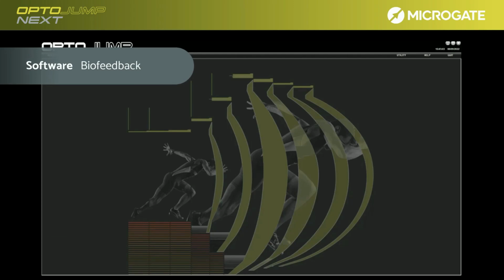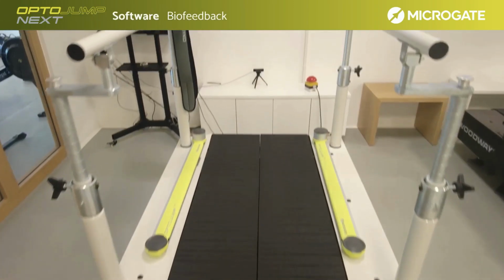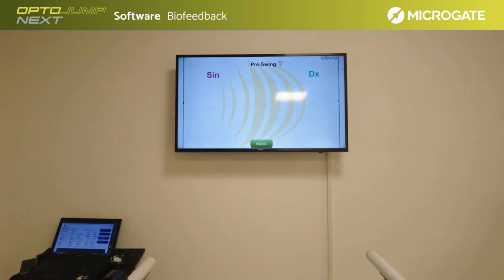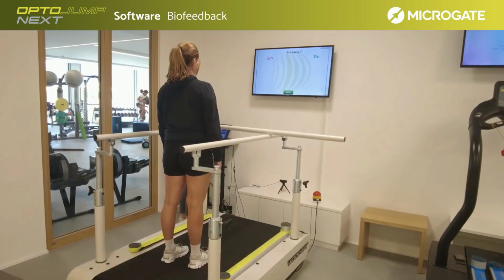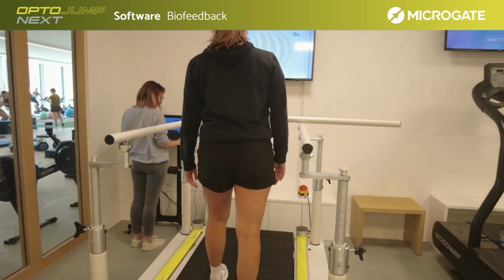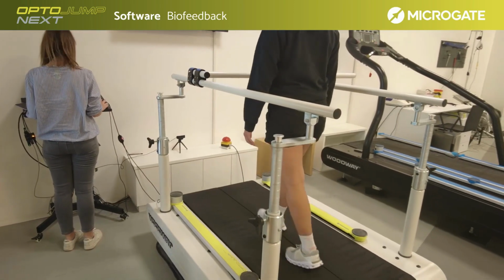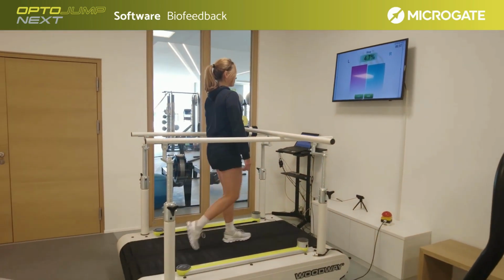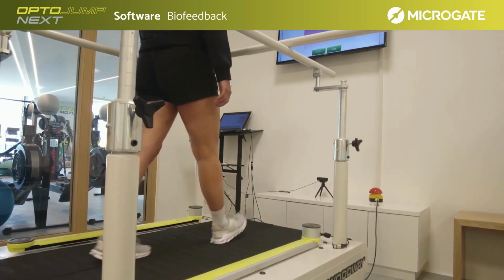On the biofeedback module, the athlete sees some basic test parameters in real time on a second monitor, usually a large TV or a tablet placed in front of a treadmill. The main difference from normal tests is that this is just a very fast start and run module with a minimal user interface, designed to be used directly by the end patient for minimizing asymmetry or increasing stride length. The patient trains and uses the system as a diagnostic tool directly coordinated by your own personal trainer.